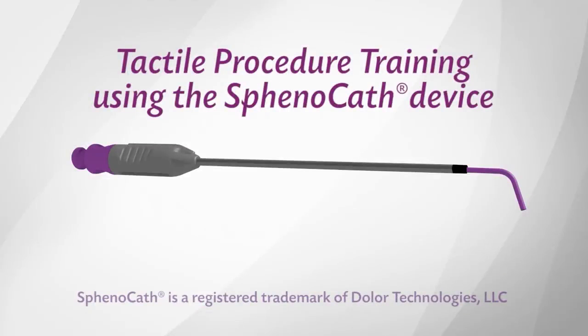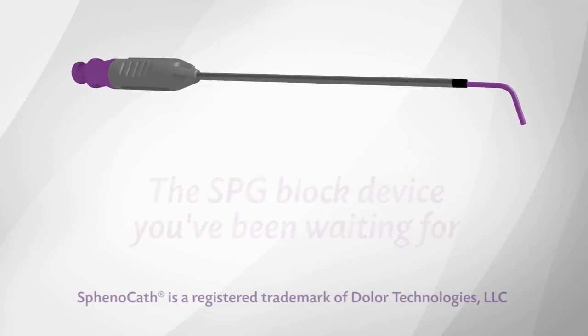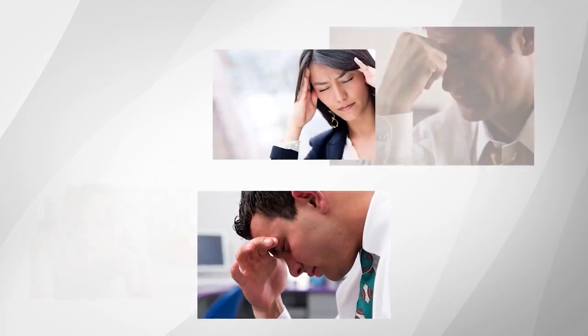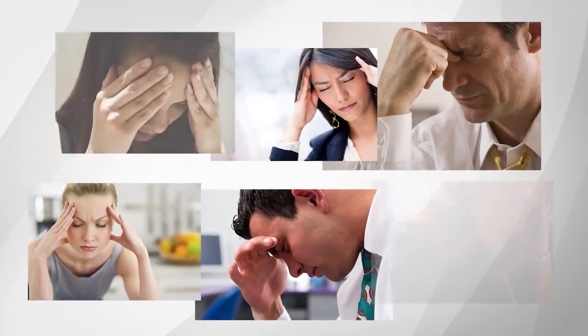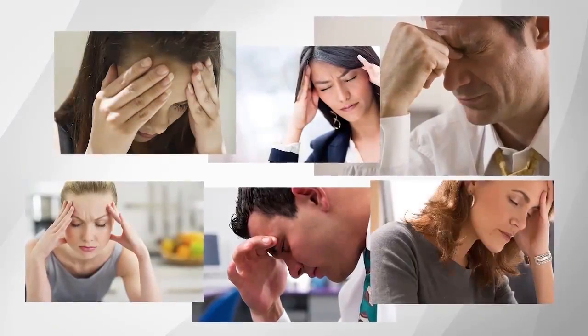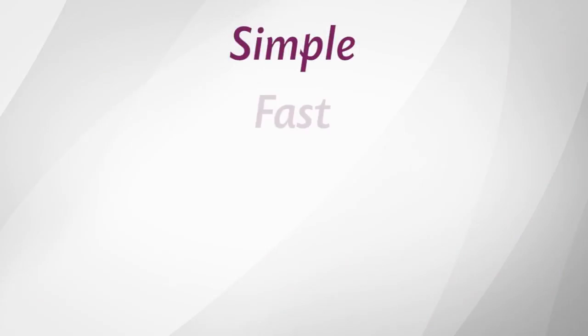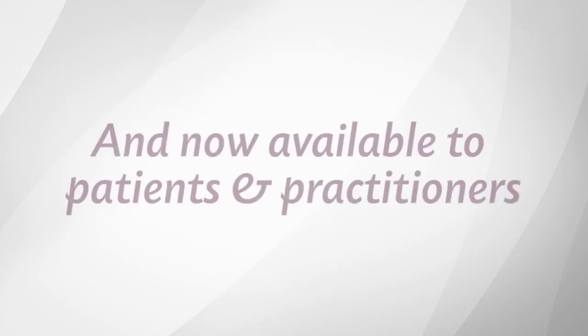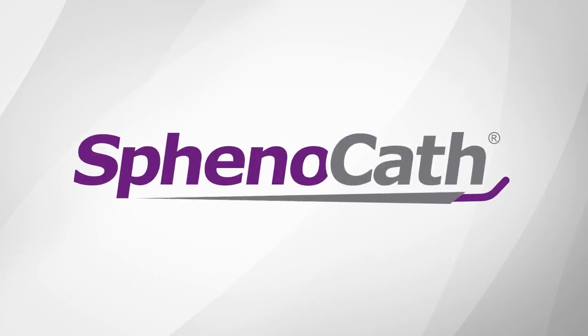Sphenopalatine ganglion (SPG) blockade has been utilized for decades in treating various types of headache and facial pain syndromes, sometimes yielding promising outcomes, but unfortunately, frequently resulting in failed treatment results. However, providing this procedure in a simple, fast, effective, and affordable manner has been difficult to achieve. The SphenoCath addresses all of these challenges.